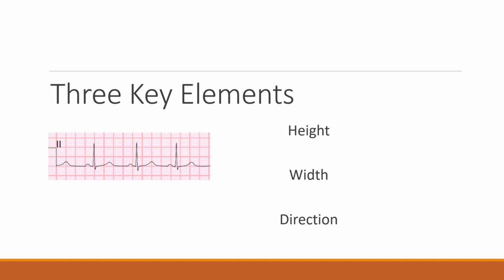You see this with your limb leads versus your precordials. Often your precordials are bigger, all the waveforms look bigger, and that's not because of anything other than the electrodes that sit on the chest are just closer than your limb leads are. So height equals amount of energy, and that's going to be key when we talk about a few things coming up.